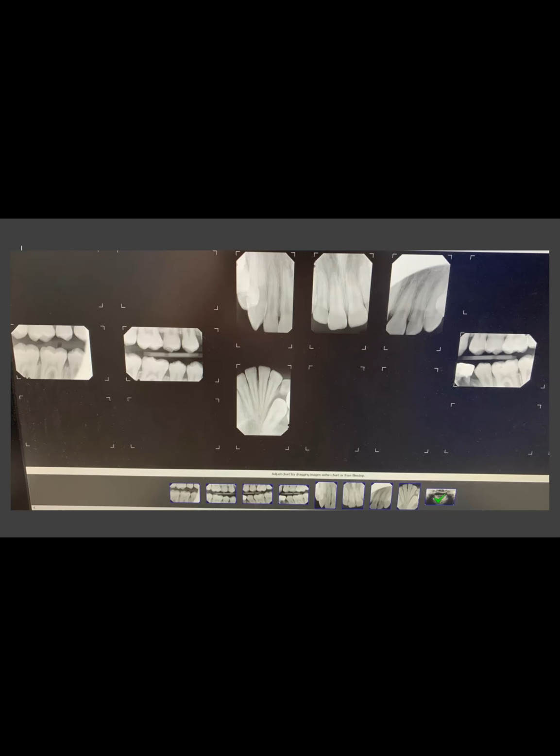Who are we going to pick on, Dr. Sally, right now? This is the x-rays that was sent to me. Whoever you want to. Rose, how about Rose? I love Rosemary. Sure. Hello. Hi, Rosemary. How are you? Good. How are you? I miss you. I miss you too. What do you see? Tooth 74.